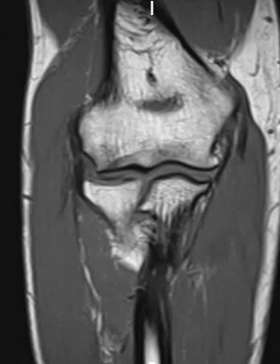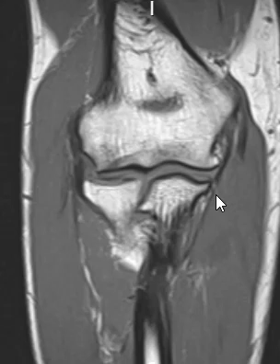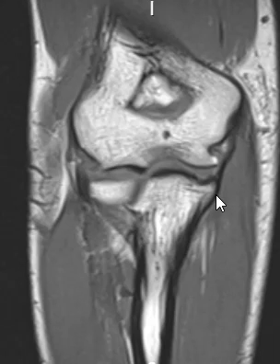Hello, this is Dr. Gay from First Lake MRI, and this is a patient who is 32 years old, had a nonspecific injury 6 years ago and continued pain, and they came in for an MRI. So this is a coronal T1 image of the right elbow.